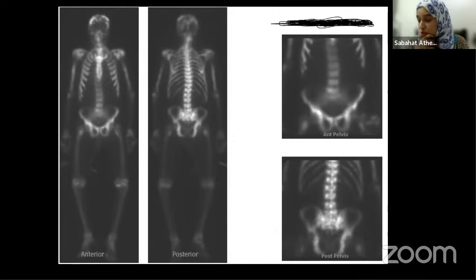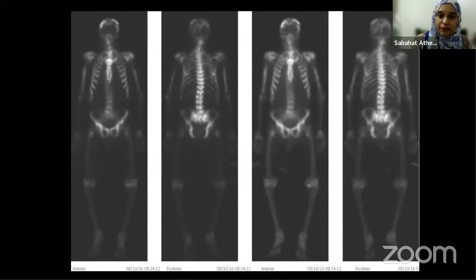Very well done. As usual, the RadioGyn audience is so enthusiastic and full of energy. Excellent. Now we are coming to the causes of super scan. What do you think? If I say this is a male patient, so what is the cause of the super scan here? Okay, I think again there is some lag of the chat, so I will proceed.